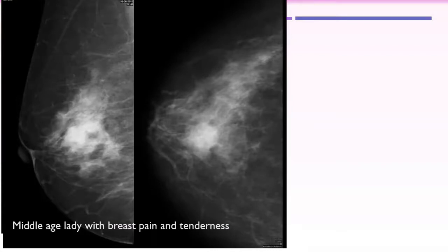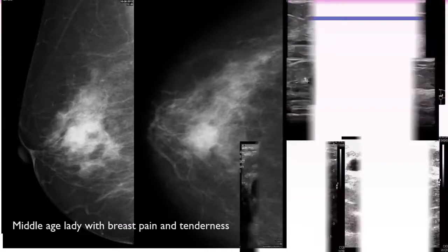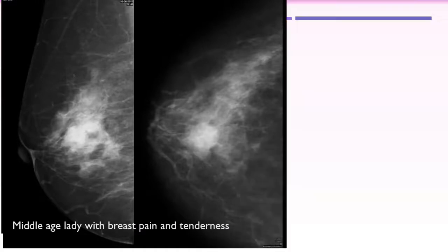Excellent, well done. It will be 4B because there are no other suspicious features: no calcifications, no distortions, no edema, trabeculations, or skin thickening. That is the only finding, so it will be BI-RADS 4B. I'll go for ultrasound to upgrade or downgrade it.